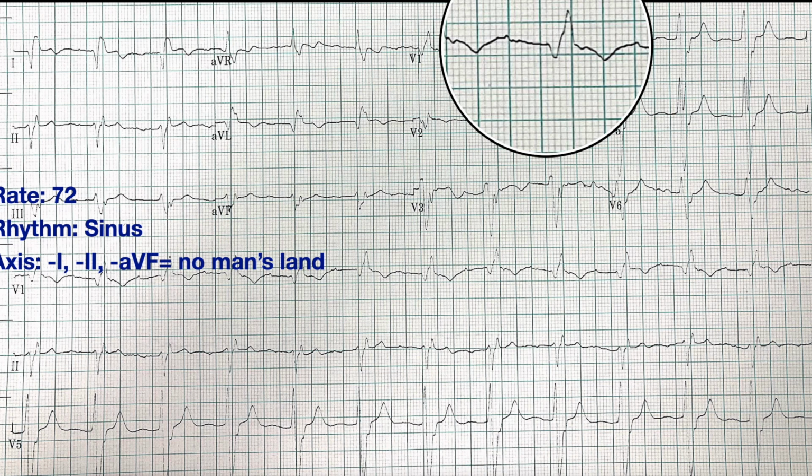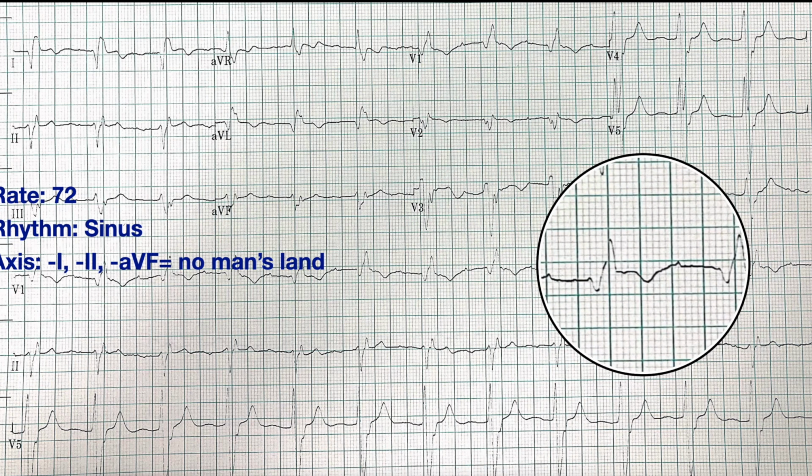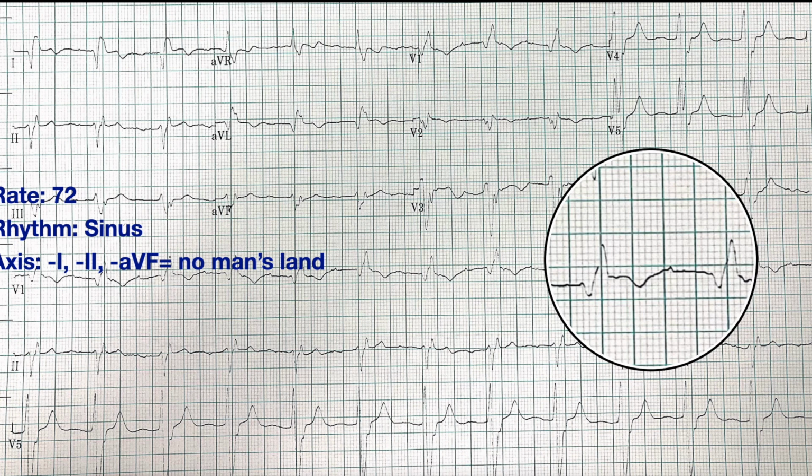It's greater than three. And then the other interval that I sometimes care about is a gross estimation of the QT interval. If you take the peak of the QRS to the peak of the next QRS complex, the halfway point is the space between the QRS complexes. Boy, that's not very clear to understand, but if the T wave is not finished by the time you get halfway to the next QRS complex, that may be a long QT.